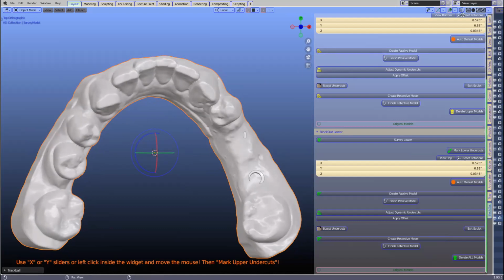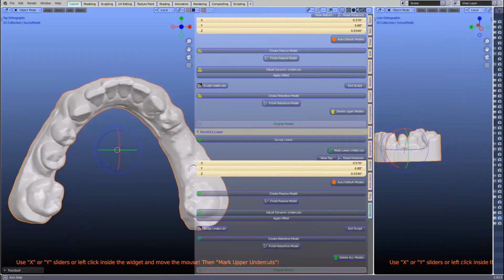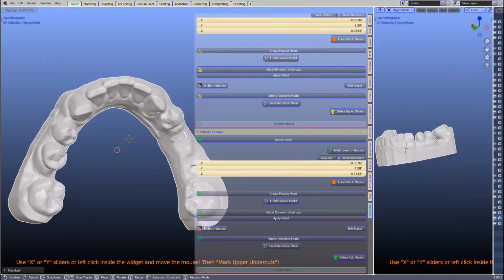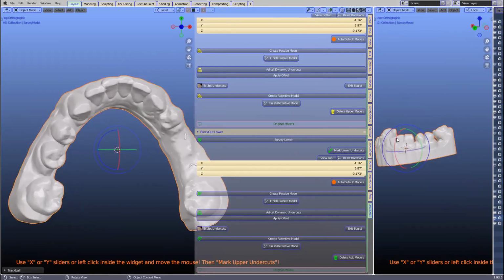It's a duplicate model, yeah. So it's not actually changing the dimensions, the coordinates in the 3D space. It's just an interim procedure to do the blockout. Yeah, but we are rotating the model, and then it flicks it back to the original position. So that's important to understand as well.